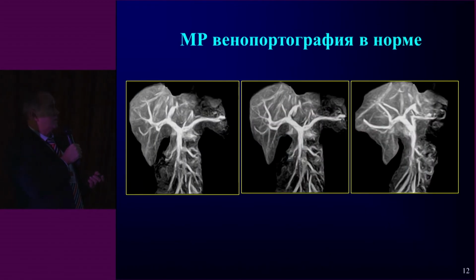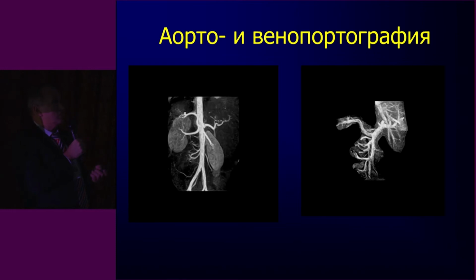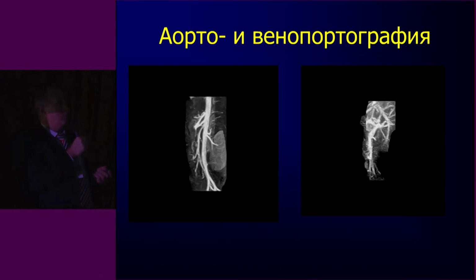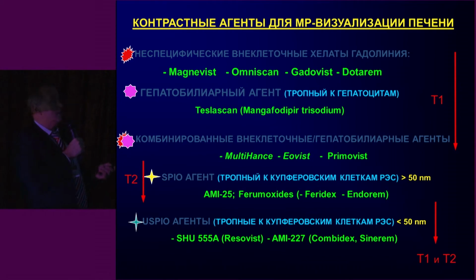Depending on the phase, you can see arteries in the abdomen. You can see the vena porta. We can do vena portography, or you can use this method for some other purposes, especially if you plan some surgical manipulations in this field. And of course, we cannot avoid saying that quite often the search for necessary contrast between the structures makes us think about the most optimal drugs, meaning those which could objectively show these or those changes.